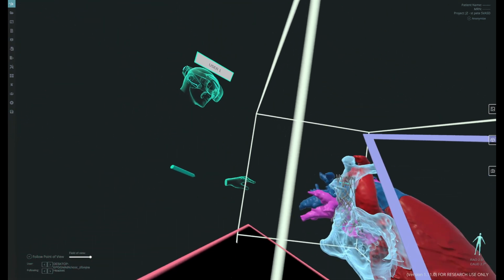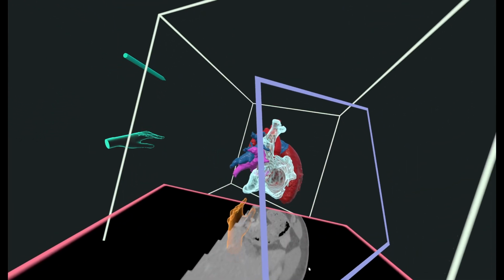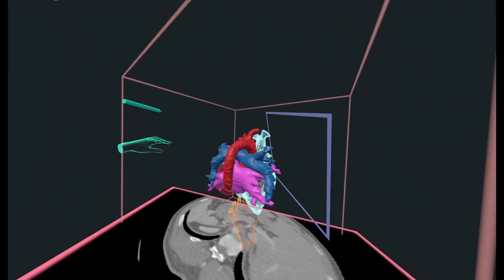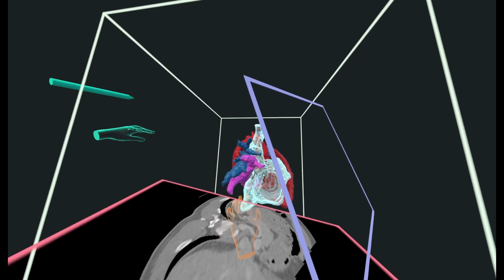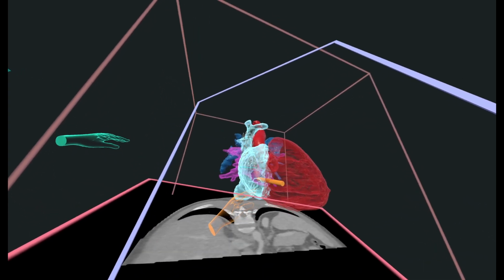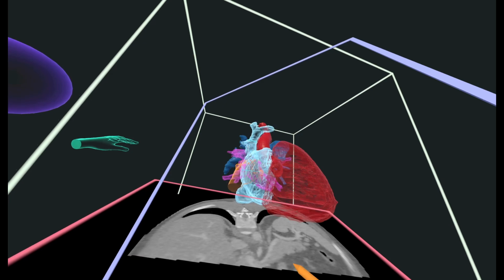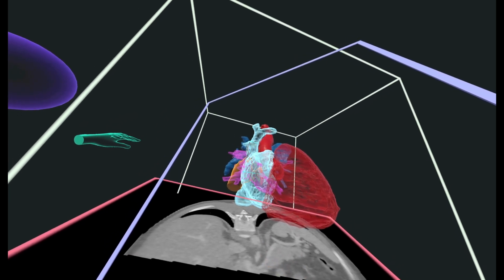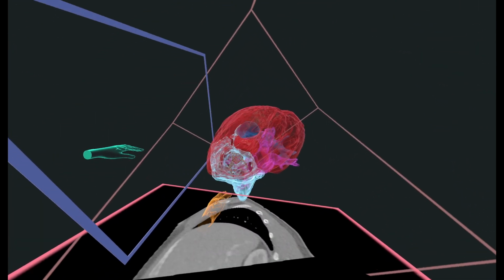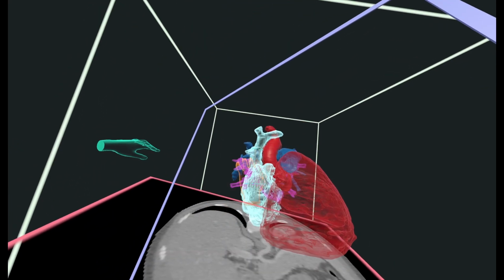Can we create transparency for the left atrium too? We can see that in a minute, so we can see the structure, so we can see that other defect. If I want to bring it down, we can see what it would look like. That's a very low area, and we can miss the anchor. So I think that position is still very good. And we're thinking that we need to flare more, so we can still do it.